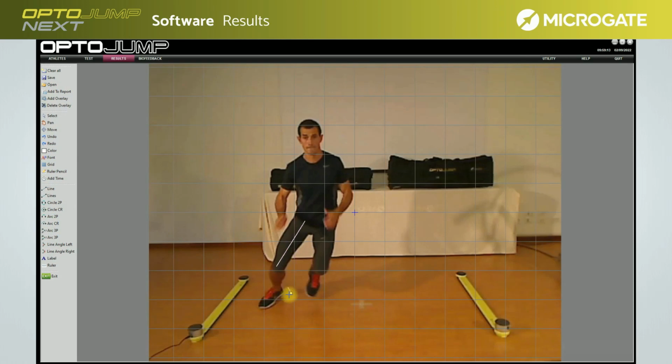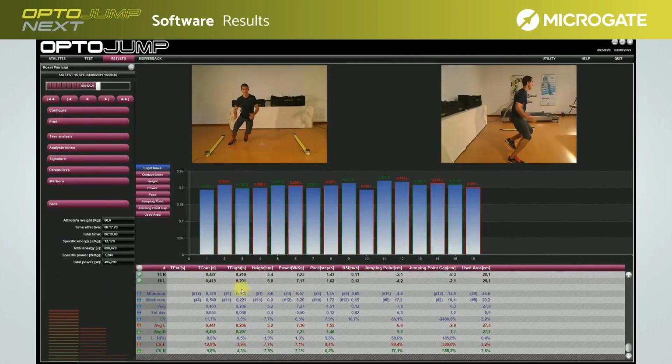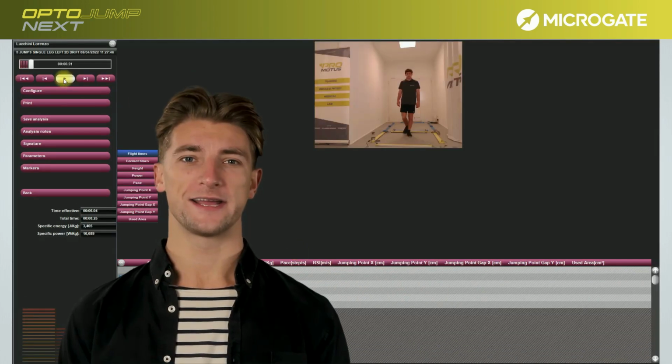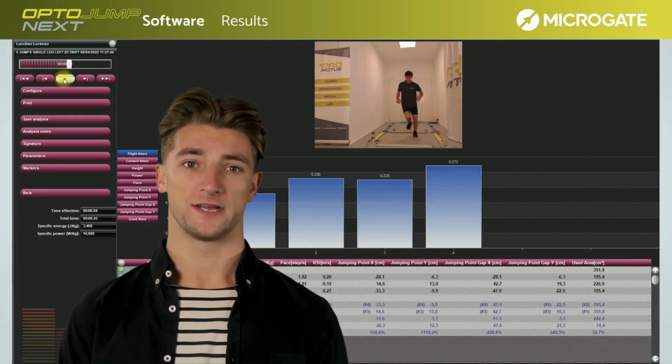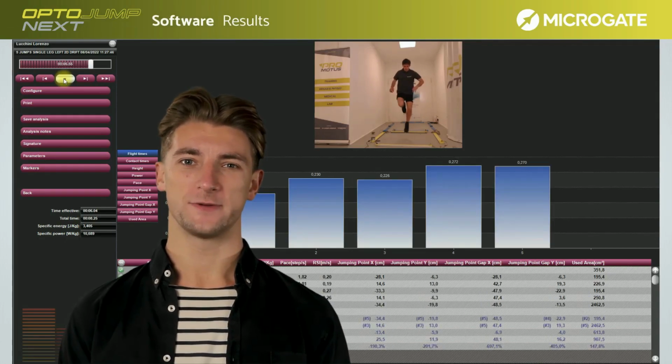The third level of the results screen is characterized by the graphic representation of the performance, while the fourth level at the bottom numerically represents the test data with representation of the individual events. Further details on the tests and all related analyses will be provided in the following chapters devoted to the in-depth study of specific tests.